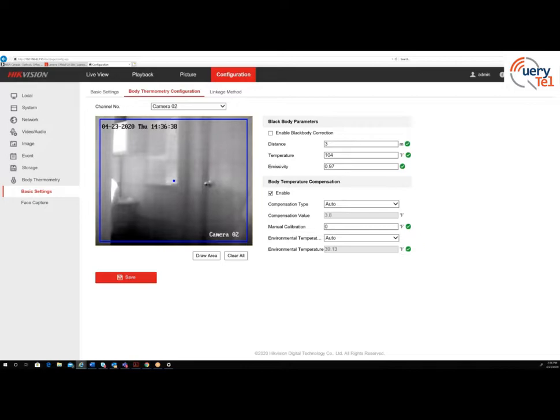And the environmental temperature, this is what I was talking about, that you need to leave it running for 40 minutes. This is the environmental temperature showing 39.13 Fahrenheit. Doesn't make sense. Supposing it's showing in Celsius. Oh no, it is Fahrenheit. Sorry about that. It is Fahrenheit, because I changed the conversion to Fahrenheit before. And if you have a black body imager, then you can have settings for that. In this scenario, we don't have it.